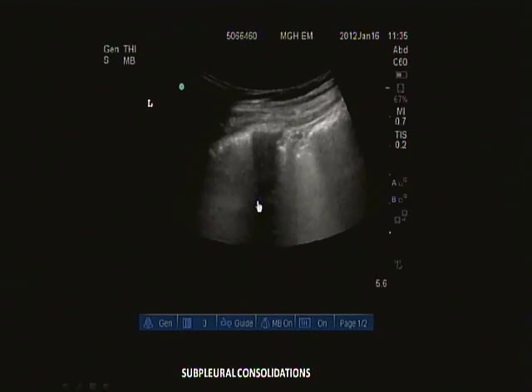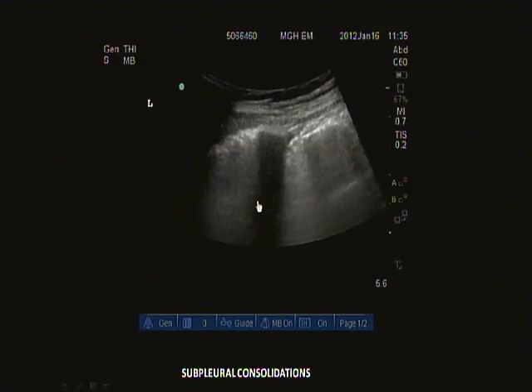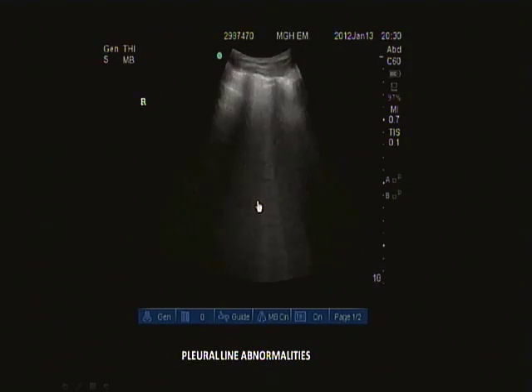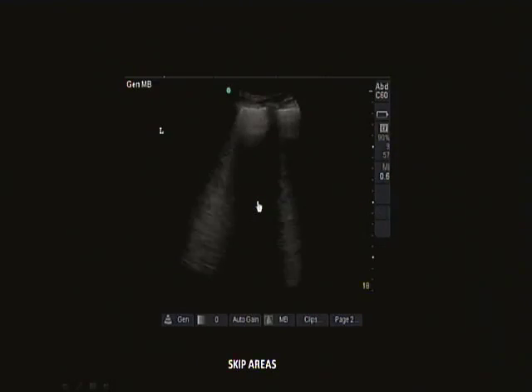When you see a pleura like this, it's not someone who flashed pulmonary edema into their B lines. This is somebody who's had chronic inflammation, chronic irritation, chronic pus in their pleural space. And this is something where you would start to worry more about ARDS or pneumonia in addition to the B lines. And so this finding, along with, here's another picture. It's not quite as obvious, but you can see here's a nice thin pleural line, and here's a little more lumpy bumpy pleural line.